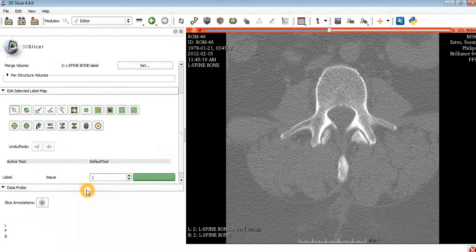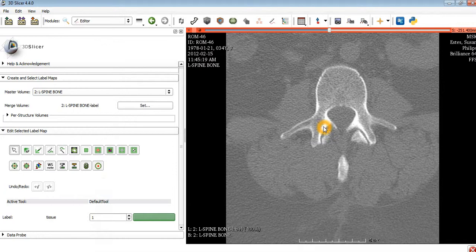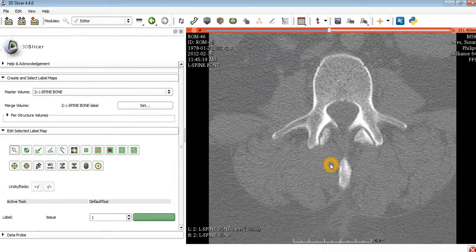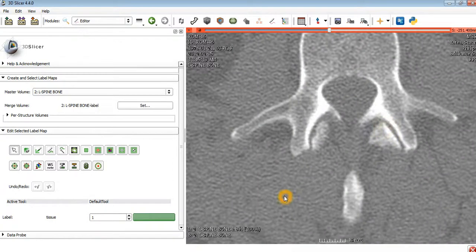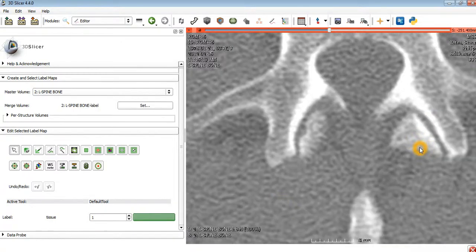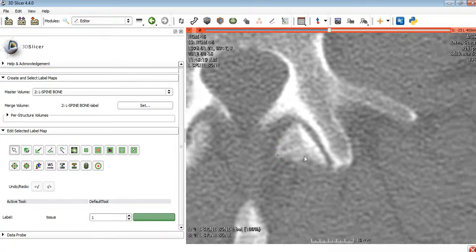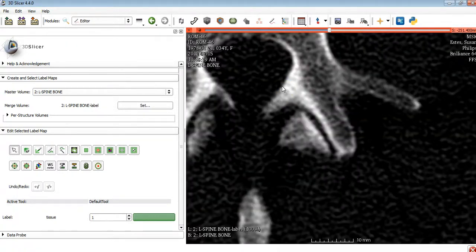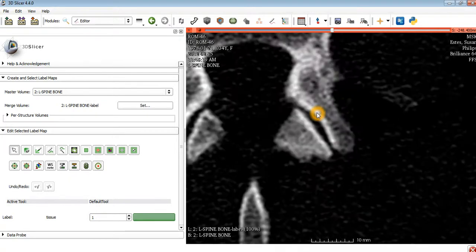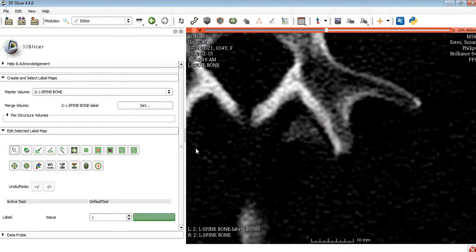It's not my software, but you essentially go in with this tool and pick out the points that apply to each surface. And so first I'm going to zoom in really as close as I can, and then center, maybe adjust some of the contrast here to make it a little easier to pull out. Now that looks good. Okay, so the first thing I want to do is just label these points here.